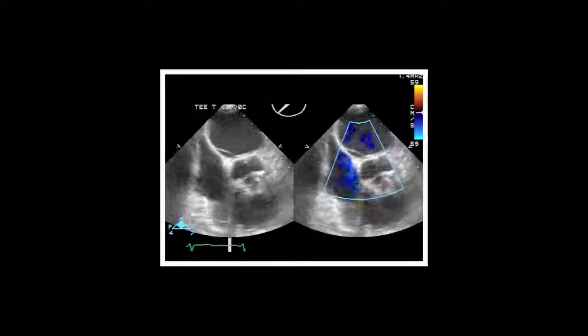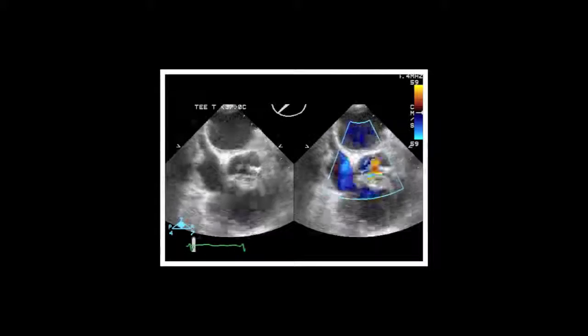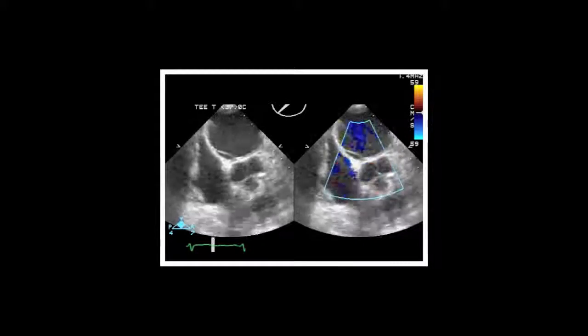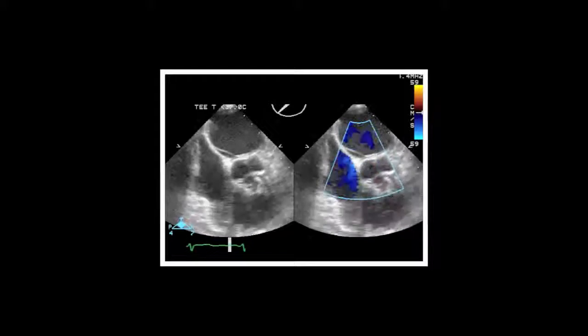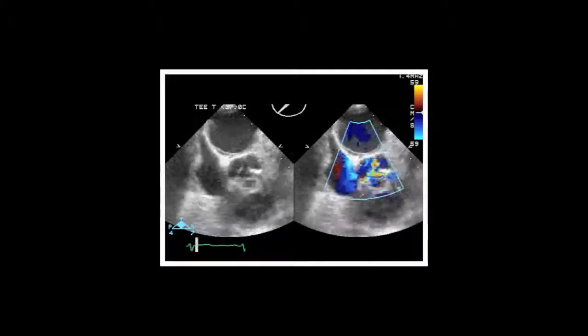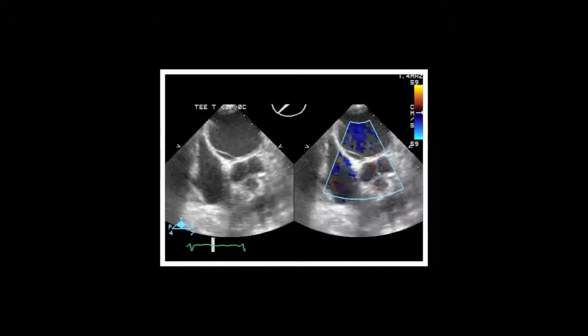In this example, we see to the left a heavily calcified, possibly rheumatic valve with poor separation of the left and right coronary cusps, but a relatively mobile non-coronary cusp. We see a trace degree of aortic insufficiency on the right in diastole. So this is probably somebody with moderate aortic stenosis and trace aortic insufficiency. We would have to do further testing on both, however, to confirm.